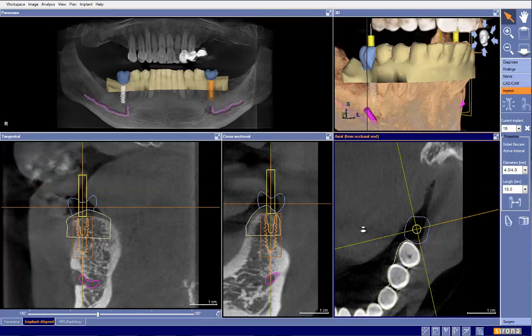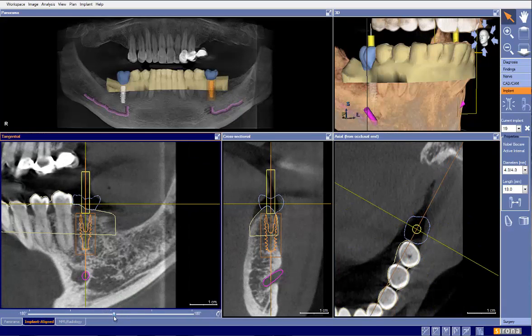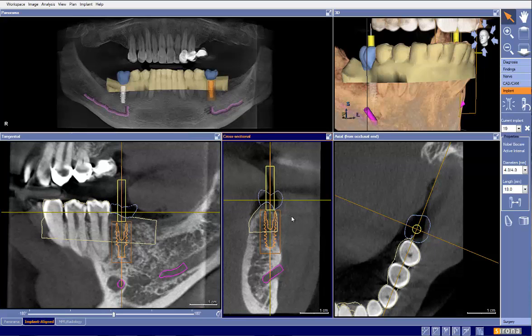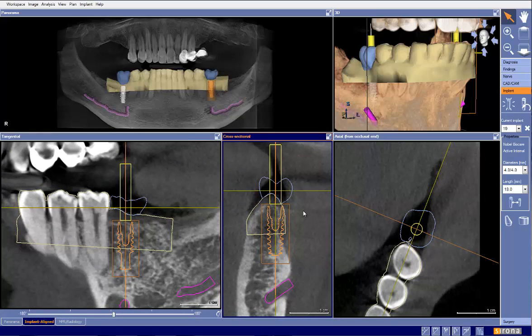And based on our plan, again, if we take a closer look at it, our occlusal plane looks pretty darn good. Maybe we could tilt it just a hair that way. It's no big deal there. But what I want to work on in this plan, and I haven't done this in advance, I'm doing this on the fly, is can we do this? Something about this doesn't look right to me. The resorption pattern just doesn't look right.